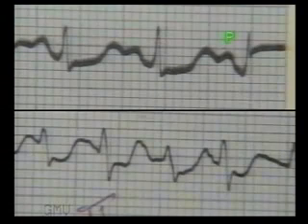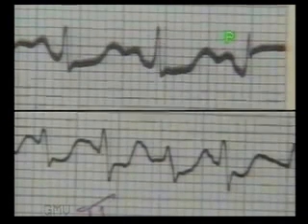In this ECG, P waves are difficult to identify in the lower lead. But you should observe all the leads carefully for P waves. Though they overlap with T waves, usually in at least one of the leads it is possible to identify P waves. Note how prominent they are in another lead in the same patient.